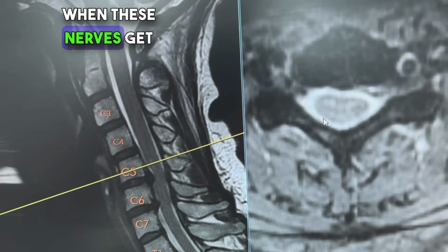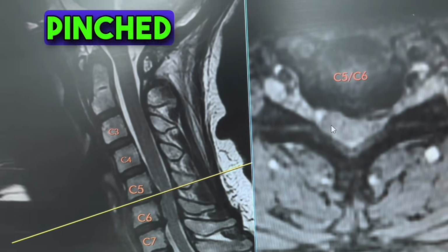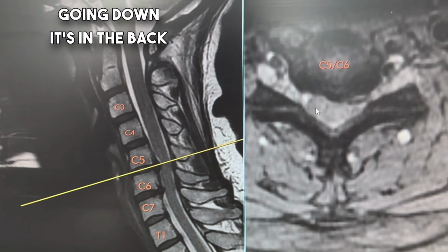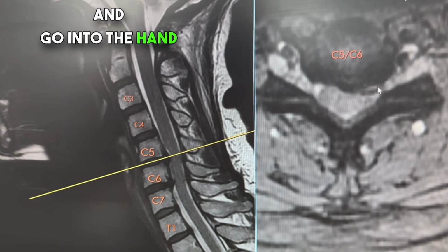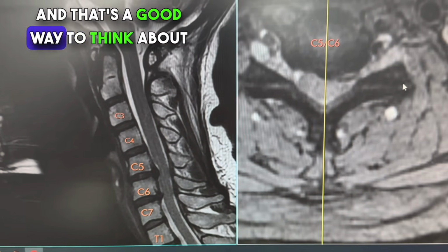When these nerves get pinched, that's what can cause radiculopathy, the nerves getting pinched. That can cause numbness or tingling going down the arm, and if it's in the back, it can go down the leg, it can go into the hand. Again, this is the cervical spine, there's the brain, there's the mouth, and that's a good way to think about it.